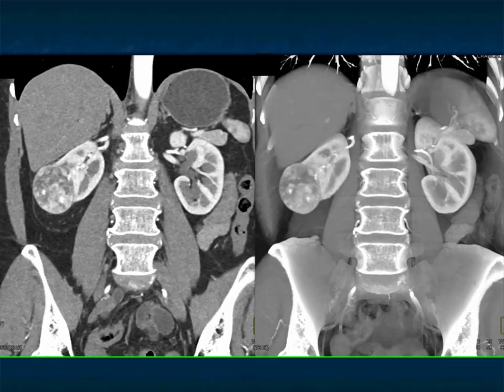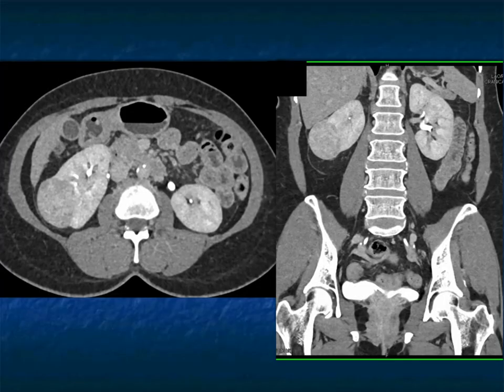So you can see the early phase imaging shows you a bit of the renal artery, shows you the cortical medullary differentiation, and the lack of cortical medullary differentiation where the mass is. This also explains why sometimes very small tumors will only be seen in a cortical medullary phase. But this is a solid hypervascular mass. By the time we reach the excretory phase, the mass is solid, it's enhancing, but it's washed out.